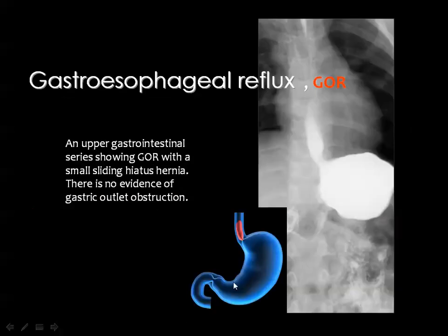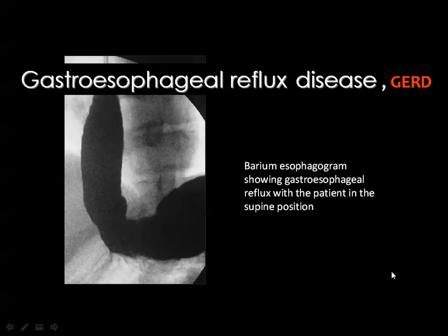In gastroesophageal reflux, the contents of the stomach can be easily passed retrograde into the lower part of the esophagus. And the gastroesophageal reflux does not need the Trendelenburg position, or putting the head of the patient down and the feet high up in order to look for reflux, but just look at the esophagus in the resting phase.